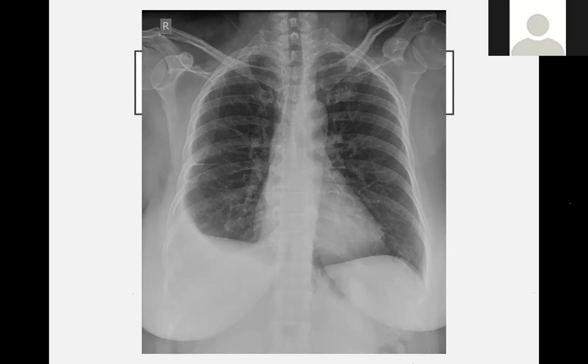There doesn't seem to be anything pathological in terms of a pneumothorax or lack of lung markings at all. There is no cardiomegaly or mediastinal shift or evidence of dissection in terms of the heart. In terms of the diaphragm, it's visible and present on the left side and its costophrenic angle, but the right costophrenic angle is blunted, it's not present, and it's pushed up, suggesting that there is maybe a unilateral right-sided effusion. And I can't seem to find anything else on this X-ray. That's my presentation.